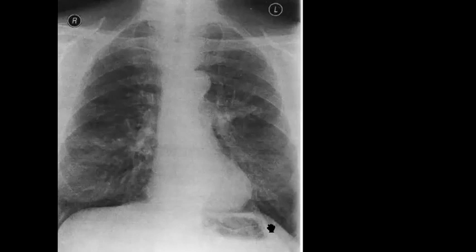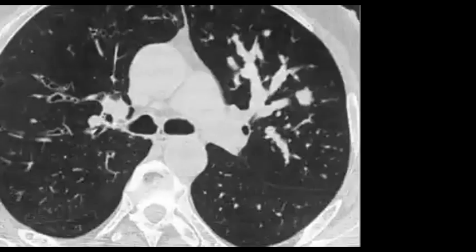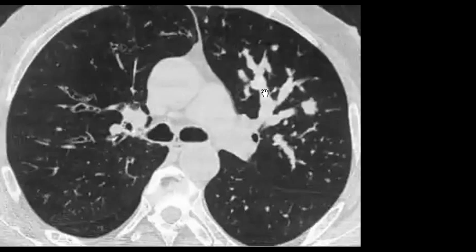Yeah, there is again central bronchocele or central tubular opacities in the left upper lobe and right upper and lower lobe. Maybe we can confirm by CT again. In the X-ray, definitely that is not the best way to demonstrate, but you can see that finger in glove sign is very obvious here.